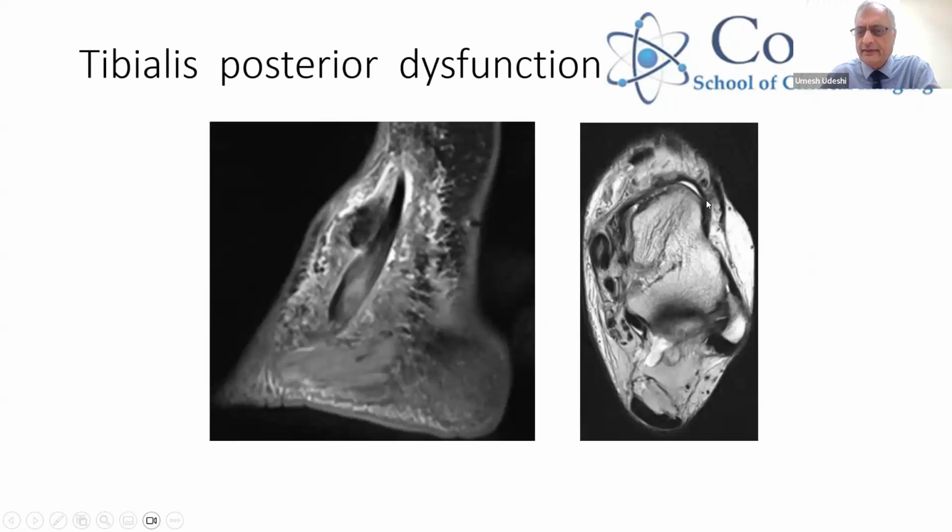So here's an axial image. I find I rely on the axial images first. I look at those first to look at the tendons around the ankle joint. Obviously, on the medial side, you've got Tom, Dick, and Harry: tibialis posterior, flexor digitorum longus, and flexor hallucis longus tendons. So the Dick and Harry here are nice and normal and small and thin and completely black. But Tom here is thickened, he's enlarged.